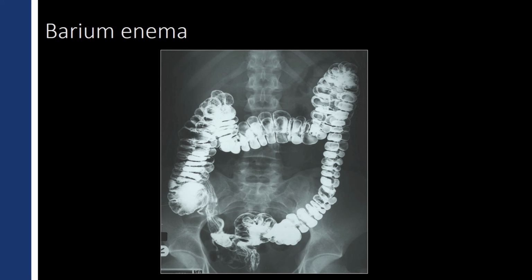But what we see here, first of all, is the haustra. Now, remember the haustra are the mucosal folds within the colon, and they don't continue all the way across. You see that little strip there, which is the Taenia coli.